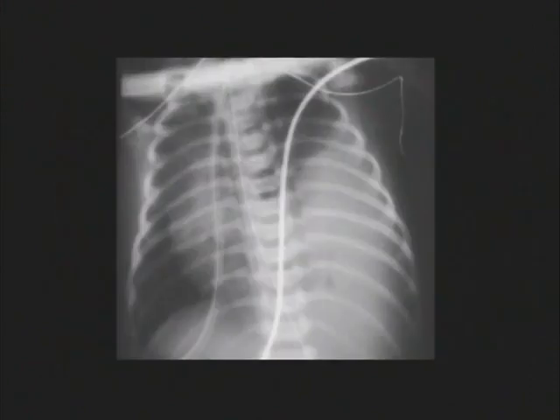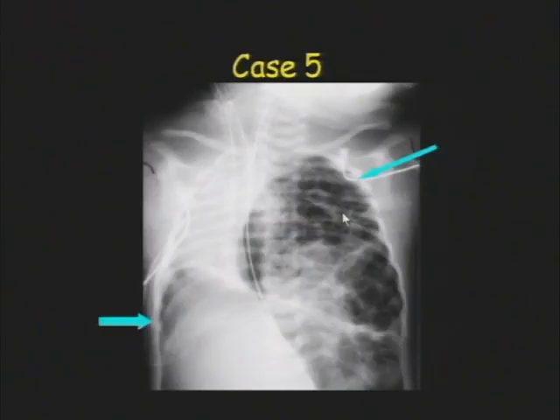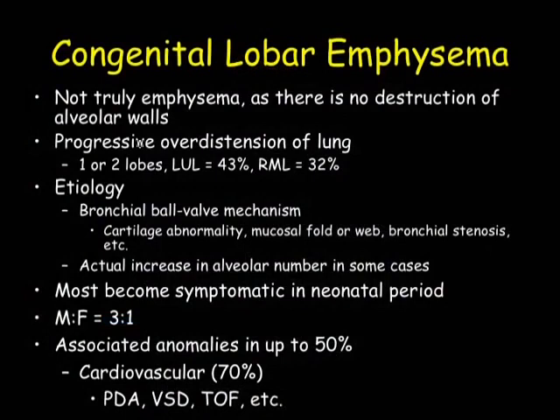Here's a solid diaphragmatic hernia that has liver up in it and the bowel that is fluid filled, again causing mass effect to the right. This is case 5, which is a diaphragmatic hernia, and in trying to aerate this baby, a pneumothorax developed in that hypoplastic left lung, and because there's direct communication between the chest cavity and the abdominal cavity, there's a large pneumoperitoneum here as well.